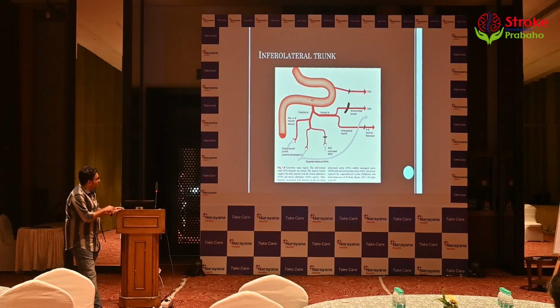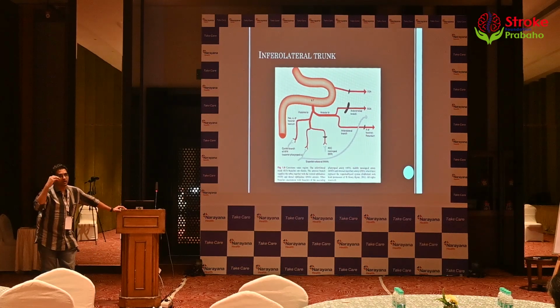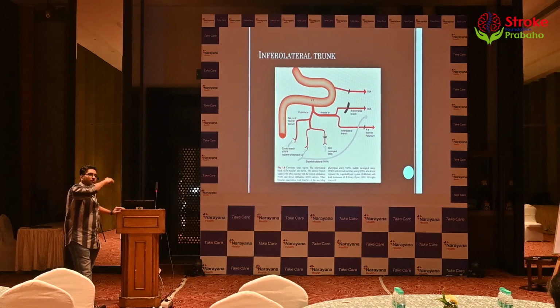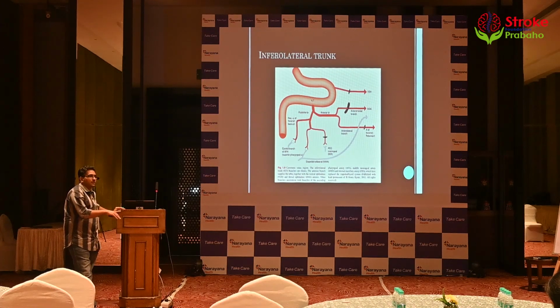Posteriorly, what happens? It will anastomose with your ascending pharyngeal system. We have to keep relying on what happens when we combine those images with this. So we are going anteriorly to posteriorly. We finish with the orbit, superior orbital fissure. Again, imagine the skull base foramina. The artery of the foramen rotundum is one of the biggest foramina there.